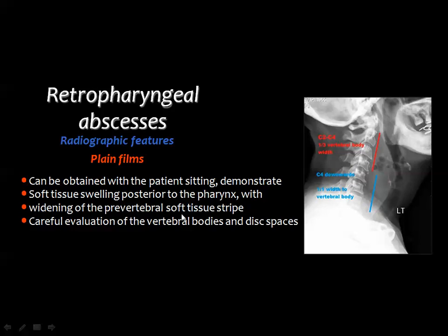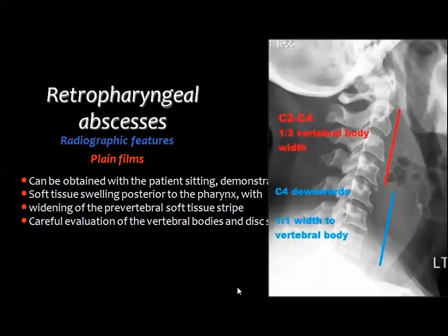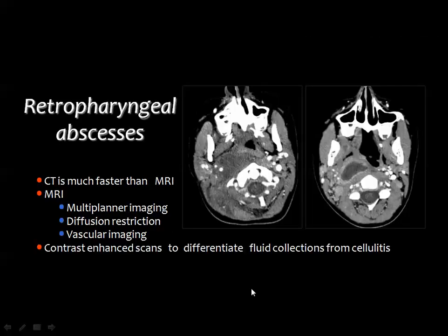Widening of the prevertebral soft tissue strip is one of the diagnostic clues in the plain X-ray.